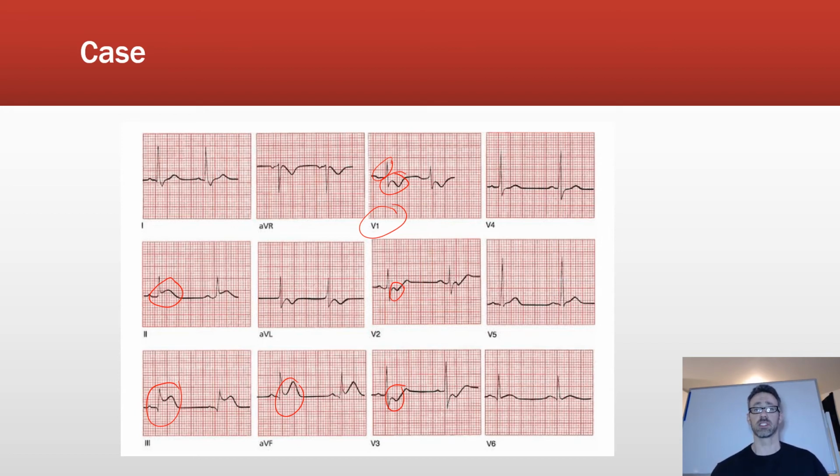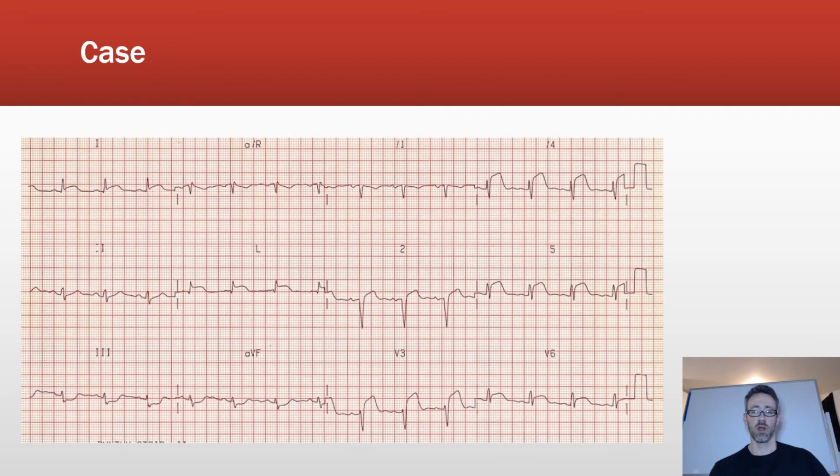And again, with most of these cases, clinical workup is important. The physical, getting the labs, and then of course, if you see the ST segment elevations, getting them in to get either surgery or medication or whatever the next step should be. So in this case, again, assess all the leads systematically. Okay, and again, it's our patient, emergency room, chest pain, and here's what you're going to see.